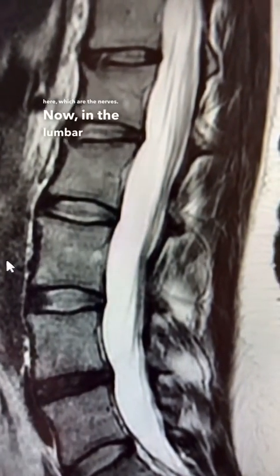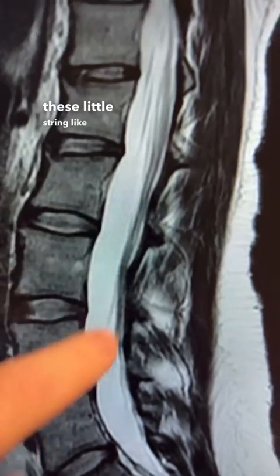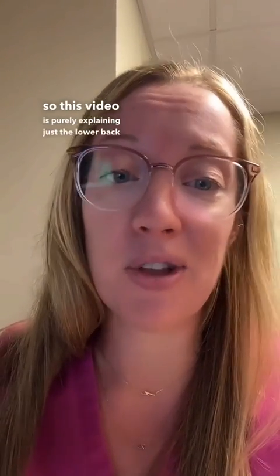Now in the lumbar spine, the spinal cord ends way up high, so you'll see these little string-like things, which are the nerves within the spinal canal. The lumbar spine looks a little different than the cervical spine, so this video is purely explaining just the lower back, or the lumbar.